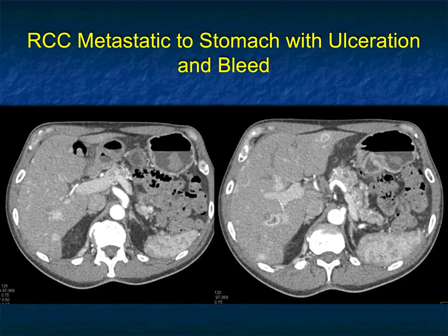And we left off last time showing you some of the cases of bleeding in the stomach. We made the point, of course, that the primary modality is endoscopy for upper GI bleeds, but it's not uncommon. In fact, I saw a case today where CT was done in a patient who really couldn't have endoscopy. They weren't sure of the site of bleeding, and sure enough, it was easily shown on CT.